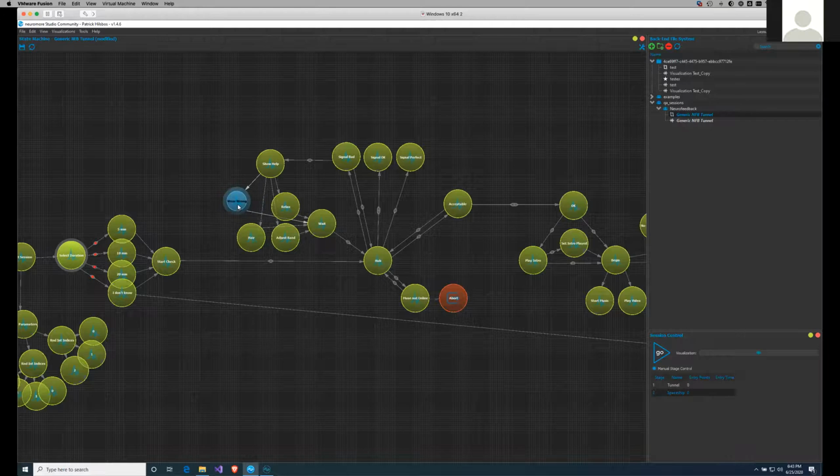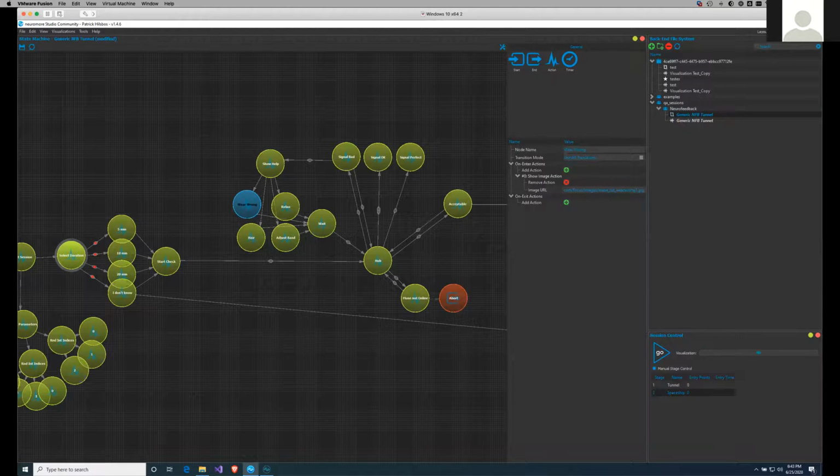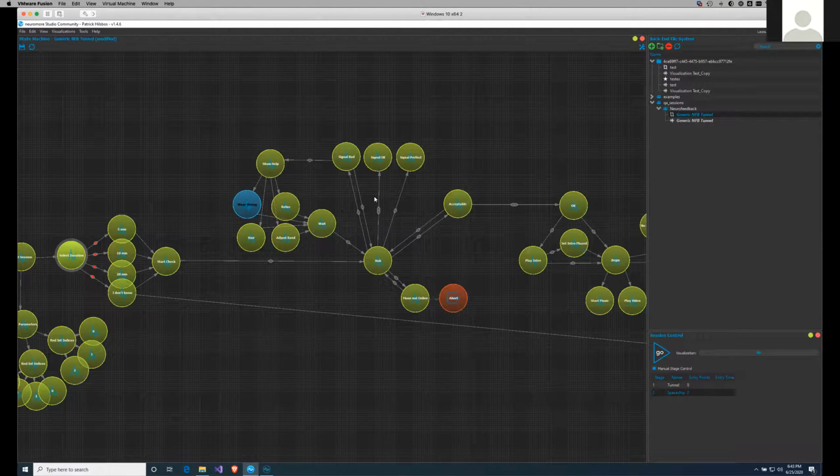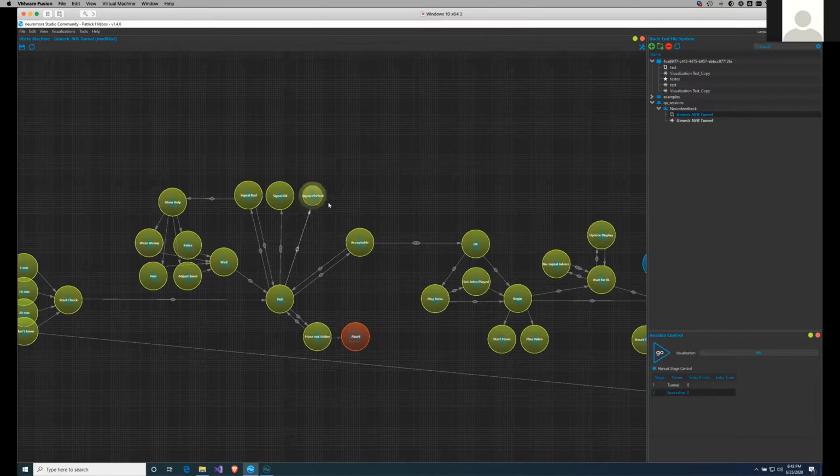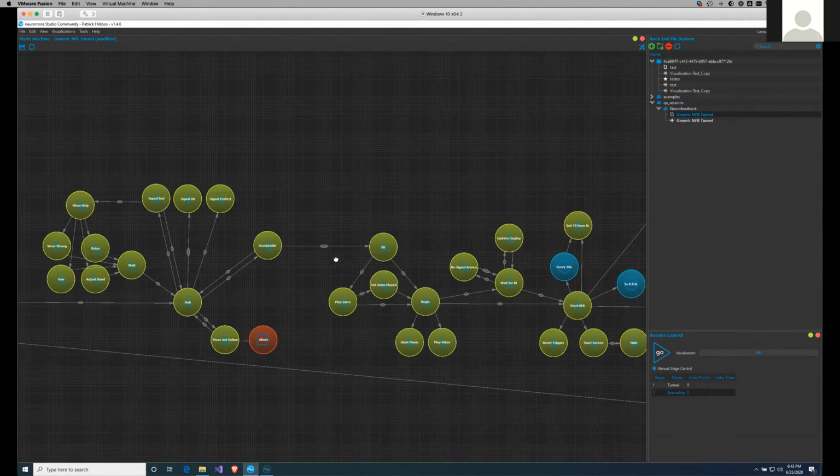Of course, feel free to change whatever you want. In those notes, you can see it's just pictures, just JPEGs that are being displayed. So you can make it as cheap as just replacing the image URL, pointing to another publicly available address. You can change the node. You might also want to add a video or whatever. Once the signal quality is acceptable, we say, oh well, it's all looking good, we're getting a good signal. We move on.